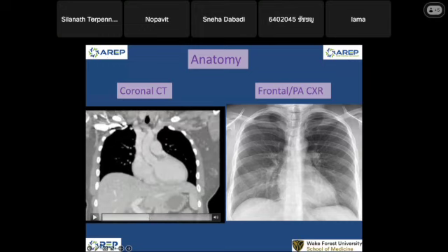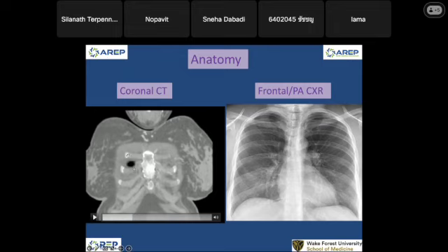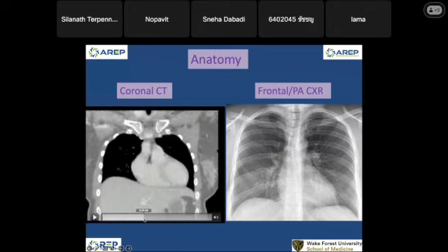Okay, that is still my clavicle and ribs here. Look at the ribs. Yesterday I showed you one thing. I said that the ribs have two parts. The anterior part is attaching to the sternum and manubrium, or the xiphoid process here. This is cartilage. Normally we don't see cartilage on the chest radiograph until it has calcification in an elderly patient. You will see that. So this is the cartilage, or anterior aspect of the ribs. Okay, I'm going to go further.